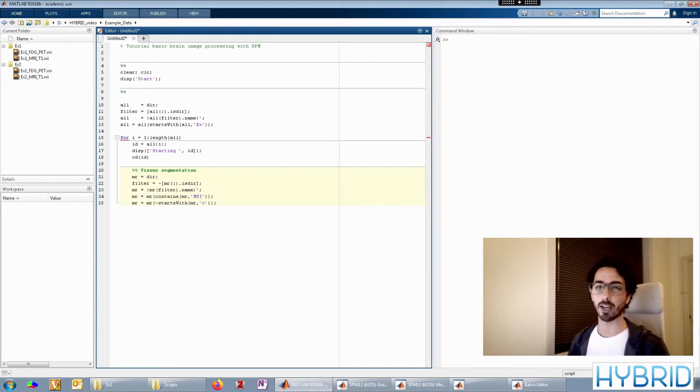And now for the actual processing with SPM. Firstly, we need to initiate it, because suppose that we didn't before, since you can be running this without loading SPM in the beginning as I did.